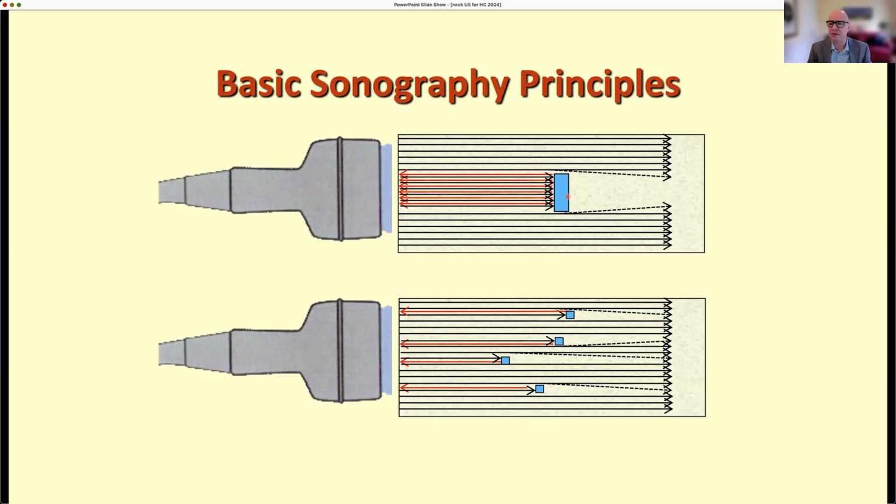Because nothing goes through, no ultrasound is reflected from behind this mass, and as a consequence, everything will be dark behind the obstacle, and that's what we call a shadow. That's what we typically see, for example, with a kidney stone in renal ultrasound. There is a little bit of scatter around the obstacle.